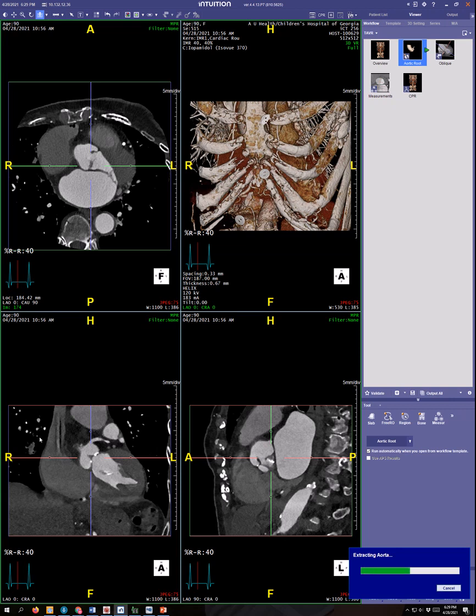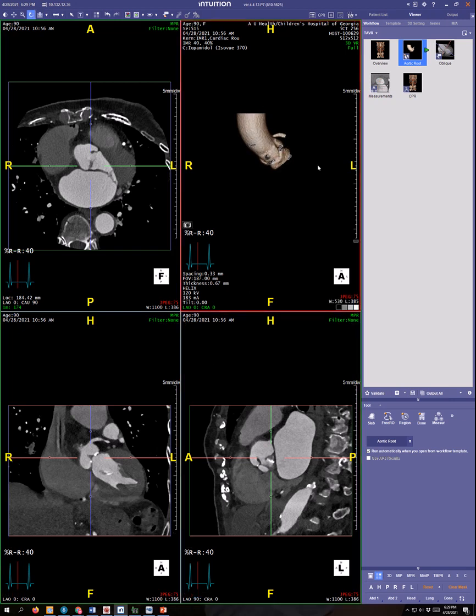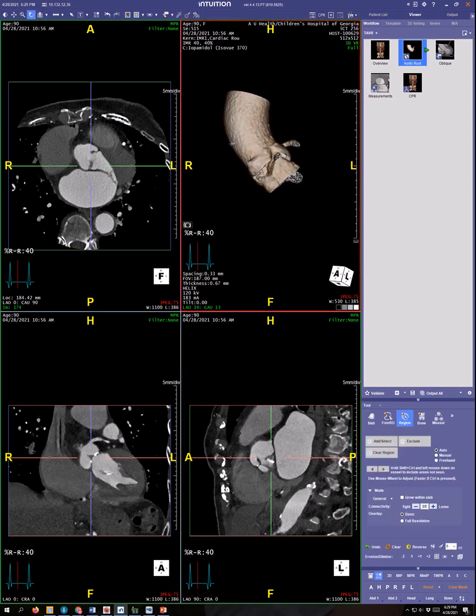While it's working, I'm a little concerned about what that is. We'll find out later. So it did a fair job here with the segmentation. Sometimes where there's beam hardening artifact, the software will take a little cut out. Let's fix that quick with, we'll go to auto, full resolution, and then here too, there's something unusual going on.